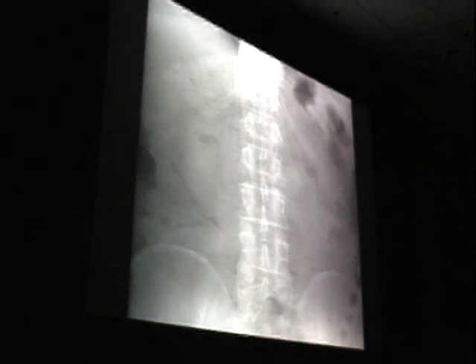Now here's a case that doesn't make any sense. And one of the things I try to teach our residents, when you see air that doesn't make any sense, it's not in bowel, it's not in the intraperitoneal cavity, it has to be retroperitoneal. You look in the right upper quadrant, there's a whole bunch of gas bubbles that don't look like this any place else in the abdomen. And if you look in the right lower quadrant, there's sort of this V-shaped linear gas collection. It doesn't make any sense. That has to be retroperitoneal air.